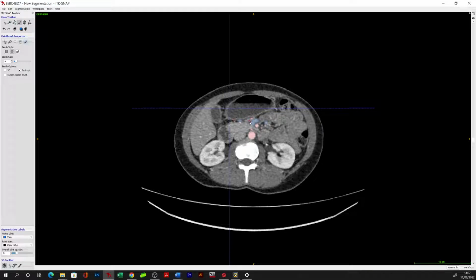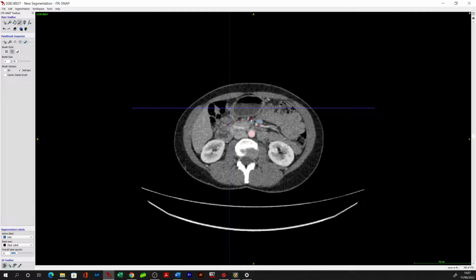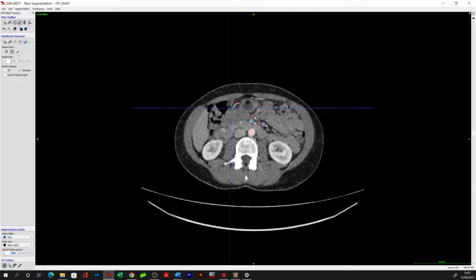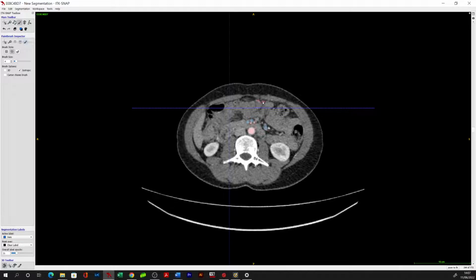So something looks to be bifurcating here to me. You've got one vessel here which is running along with the artery, and again it is corresponding to the arterial blood supply. So you can be more confident that if something looks right, it probably is right. It's when you start seeing weird configurations that you've never seen before or haven't been anatomically described in certain situations, that's when you really need to question whether what you think you're looking at is actually what you're looking at.